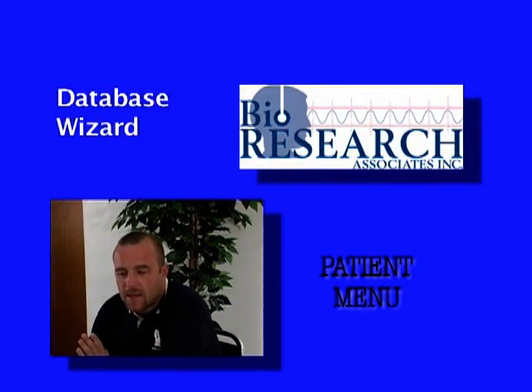BioPAC 5.0 has a new database, a completely new system of storing your patient's data and personal information. In addition to simply having the patient's name and the traces, date of birth, etc., you can have notes for your patient files, you can have images of your patients. Some of our clients like to have intraoral photos, digital x-rays, posture photos, things like that, right in the BioPAC that they can add to their reports.